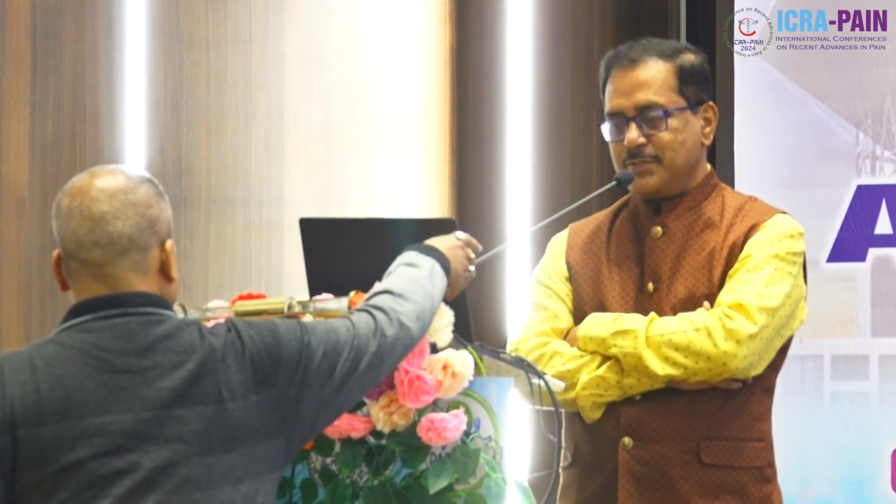Today, as we promised, we'll be starting with something very new: an ultrasound simulator to learn musculoskeletal ultrasound. Those who are present here will get free access to this software for 3 months to learn the lumbar area, basically. And I hope 3 months is enough to learn the lumbar area.